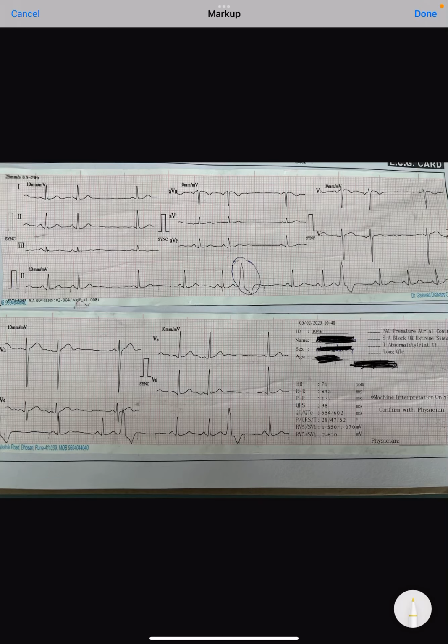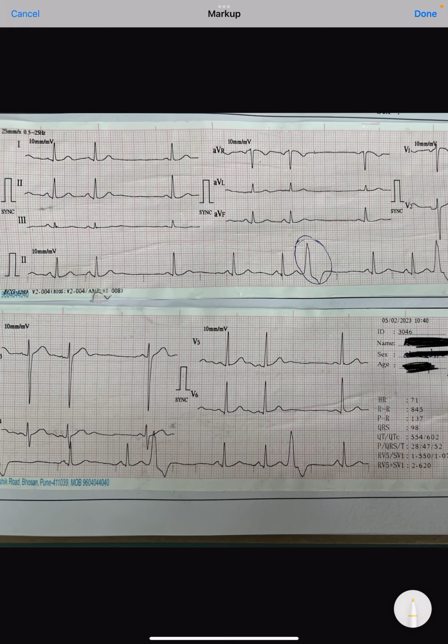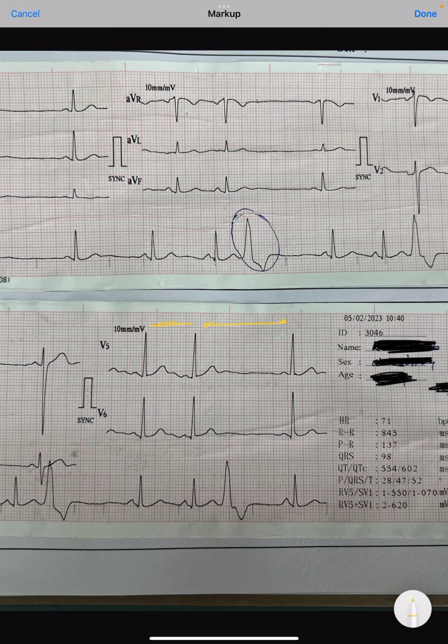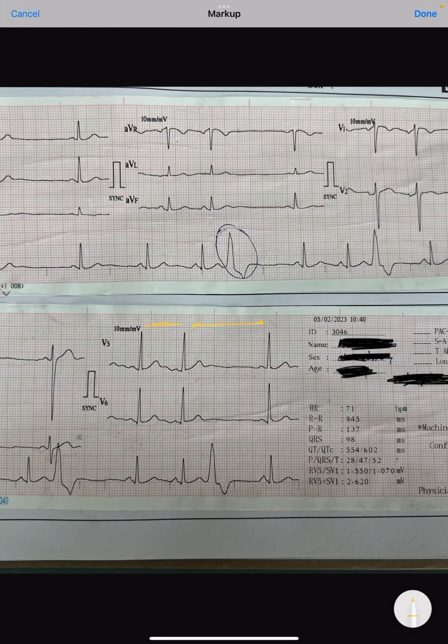Now, this is a very interesting ECG because we are going to see a very interesting thing. When we see here we have two R waves, and suddenly there is a huge drop in heart rate. So the heart rate is varying. These two R waves have come back to back, but after this R wave, it has taken so much time for a new R wave. So there has been ventricular contraction after so long a time.